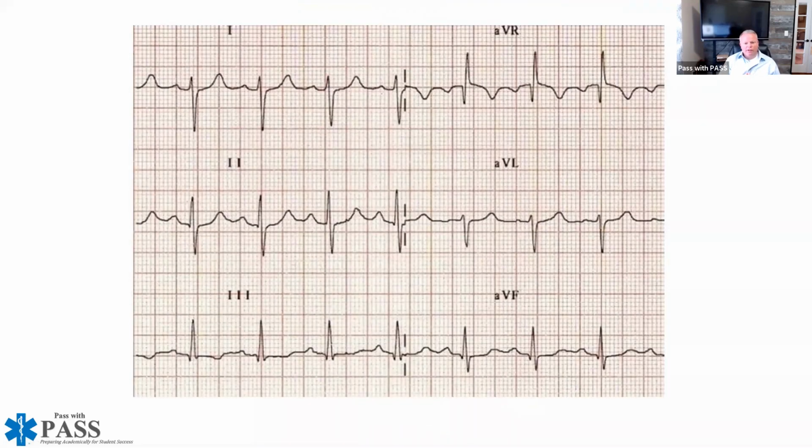1, 2, and 3, AVR, AVL, and AVF. If I look at lead 1, if I'm using thumbs, that's going down. Lead 2 is equiphasic. So I look at this and say equiphasic, so then I have to look at lead 3 or AVF. Remember that caveat? So I have lead 1 going down, and I have lead 3 or AVF really going up. They are heading right towards each other. This is going to be a right axis deviation.